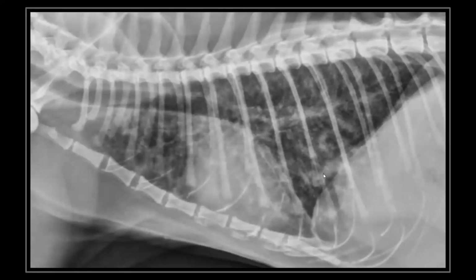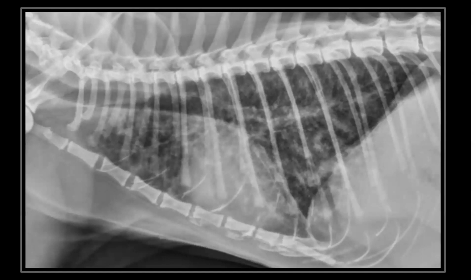And kind of same thing going on. We have these regions of interstitial patches. Okay.